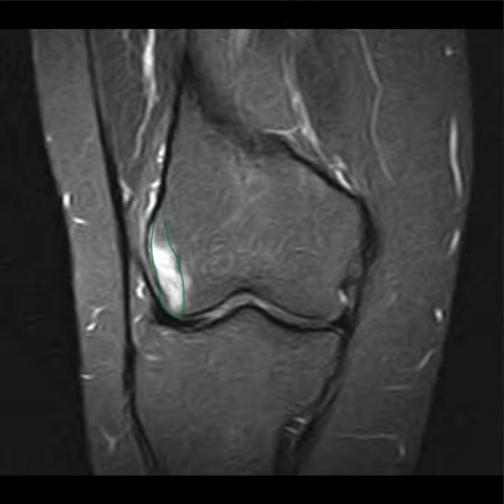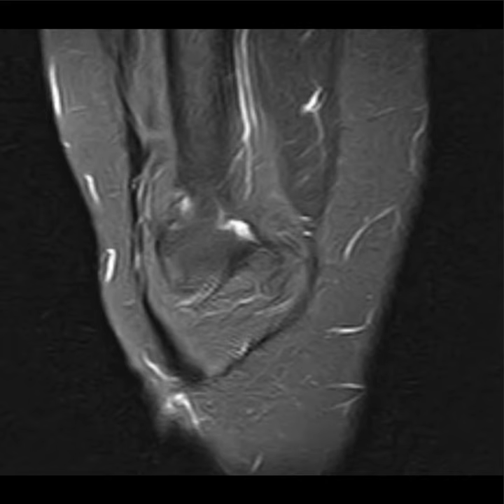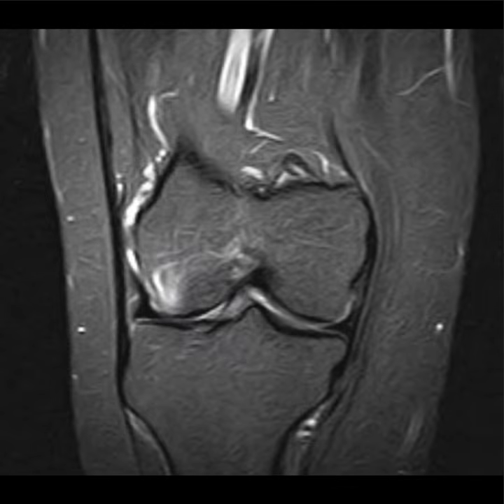And I can't see really any other abnormality. Are you sure? Did you forget to see anything else? Well, we didn't see any axial images.